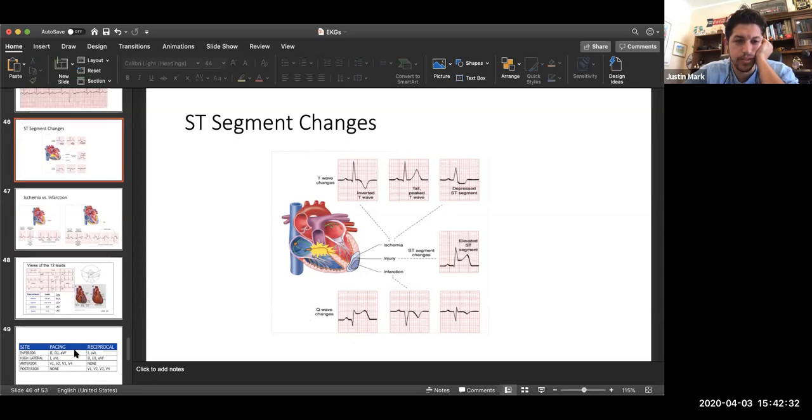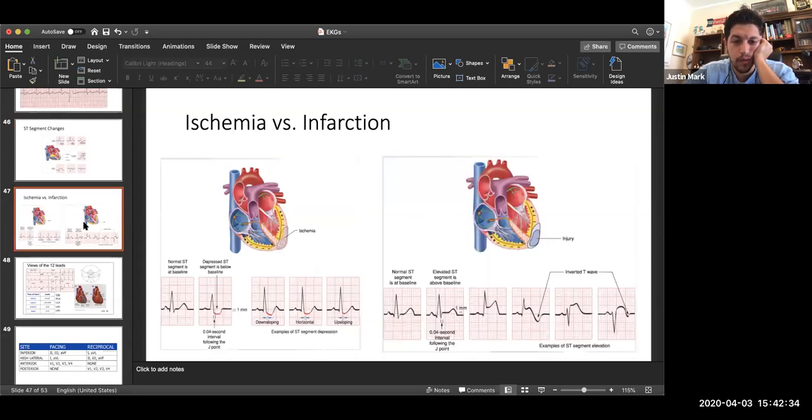I do mention it. This was from her lecture. She was basically saying how you can have different patterns of ST segment depression. I think she mentioned that if you get an EKG and you see a down-sloping ST segment, this indicates the worst prognosis versus the horizontal and the upsloping. But again, this is just pattern recognition, especially at our point.